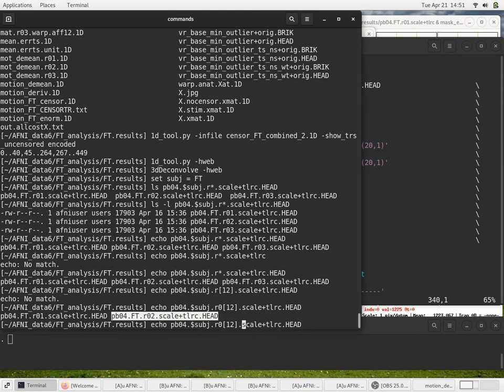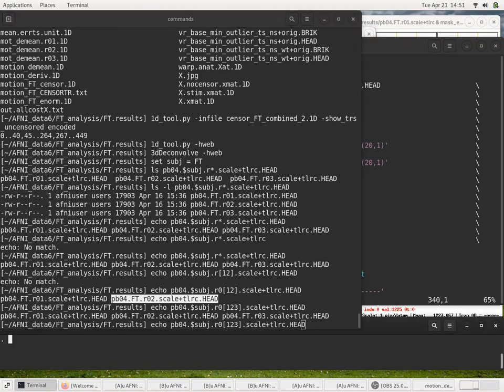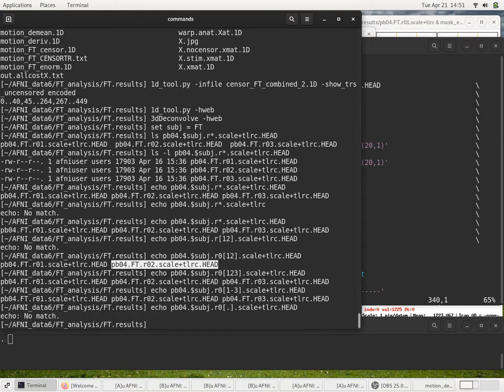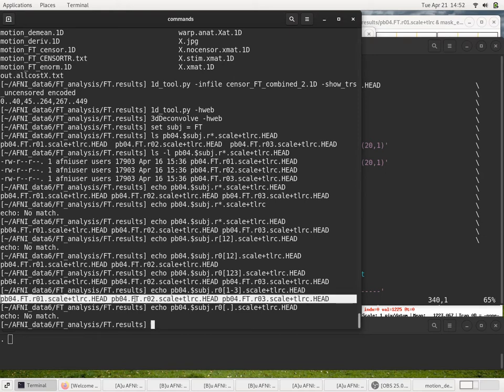If I did 1, 2, 3, or if I did 1 dash 3, I think even if I did dot, nope, maybe that depends on the form of matching that I'm using. But at least in any of these cases, the square brackets will fit one of the terms inside, and then you can match it that way.